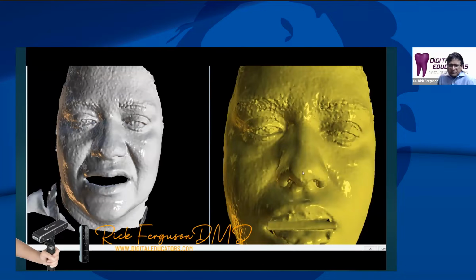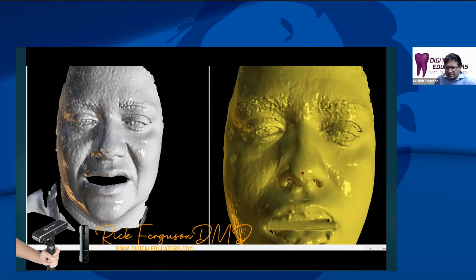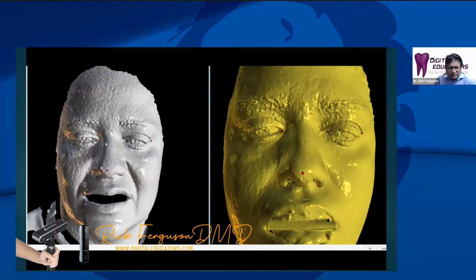I didn't speed this video up because I wanted to show exactly how it's done. So I believe we chose 5 or 6 points here. We'll see in a second.